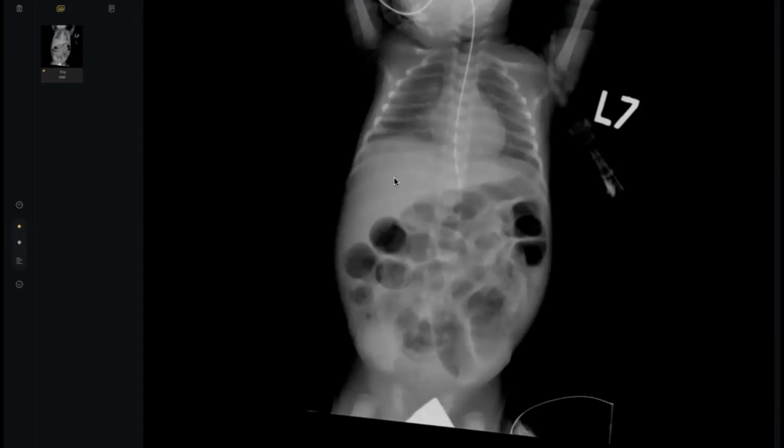If this is the same patient, I have presented with a babygram, and the nasogastric tube is seen. Its tip and side hole are seen above the gastroesophageal junction. There are mild granular densities in the chest field, and there is mild bowel dilatation, with less bowel gas seen in the pelvis. There is no definite significant pneumoperitoneum, no Rigler sign, no football sign.